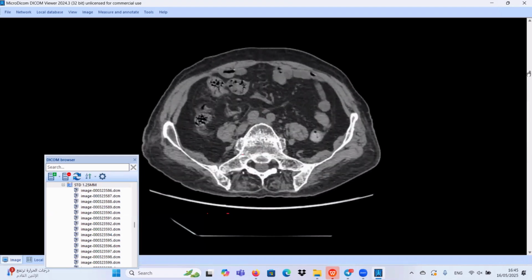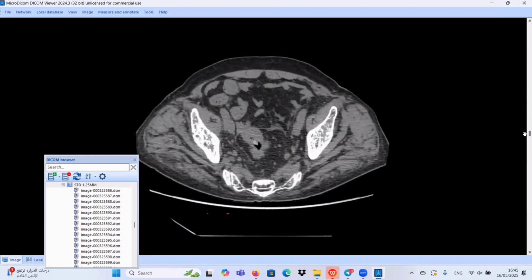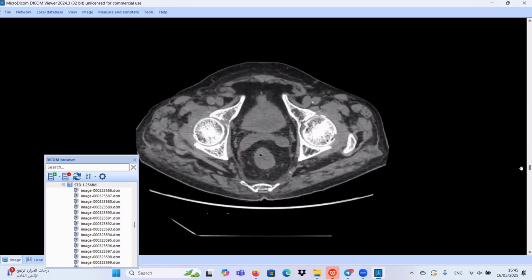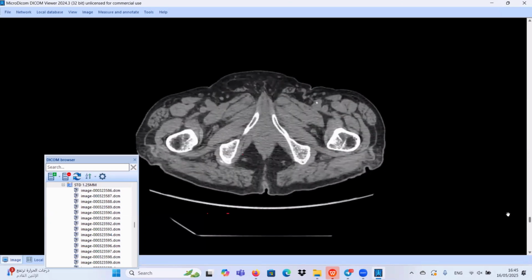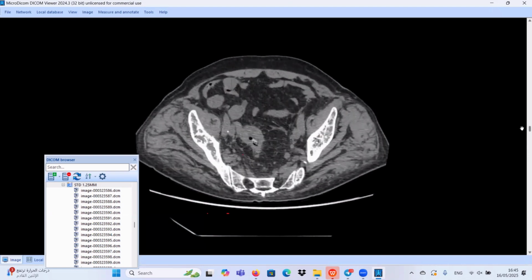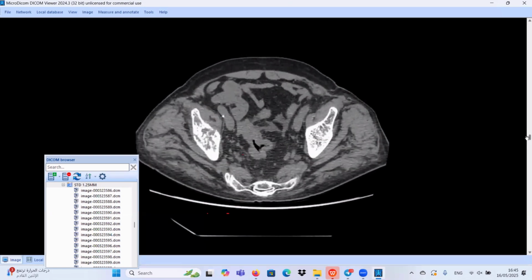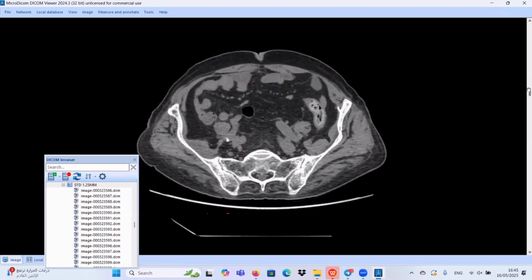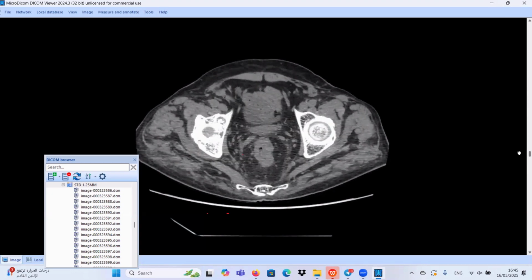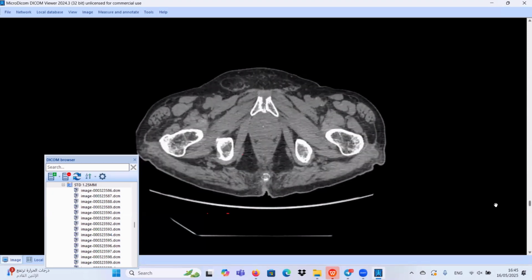So considering the age of the patient, I'm thinking of myeloma or mets and less likely lymphoma. Yes. However, I could not see any obviously enlarged lymph nodes in the given soft tissue window. Yeah, I'm looking. There are large degenerative changes and osteophytes.